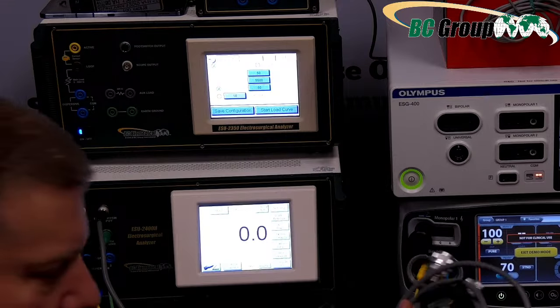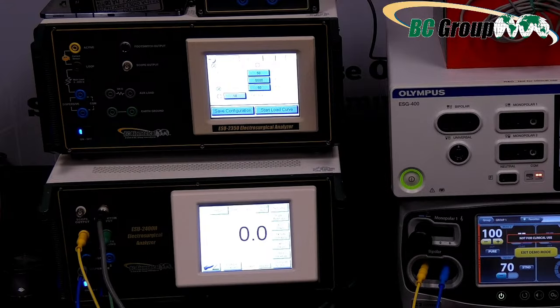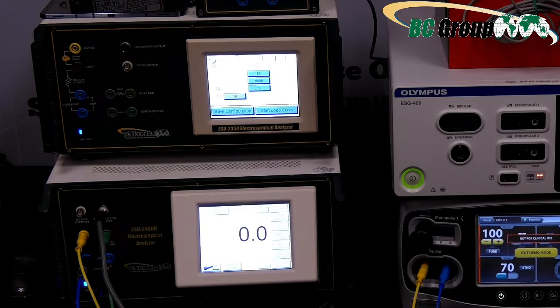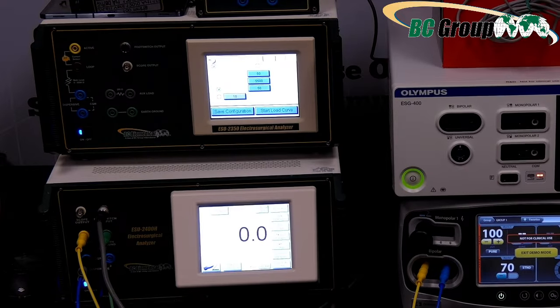here's where I would simply take my hand control that I mentioned earlier. I bet you I have it plugged into the wrong port in the back or not even connected. So let's plug this guy back here just to be sure. And mind you folks, our ESUs here might be here for a reason, so I cannot say for sure that these ones are 100% working. All right, so this is my automated cable that I'm disconnecting. And now, there we are.